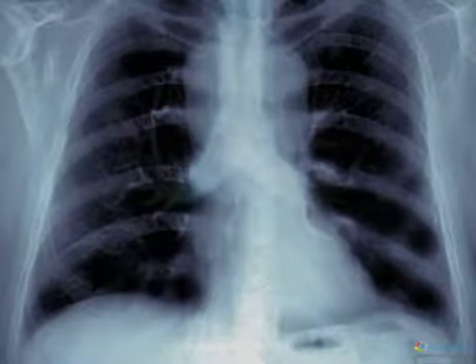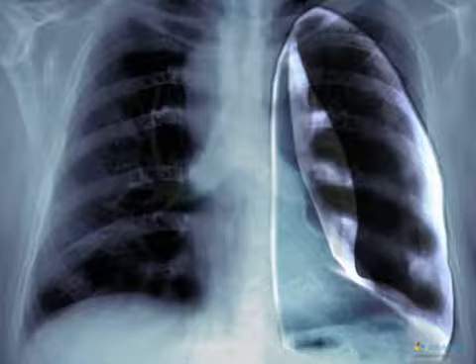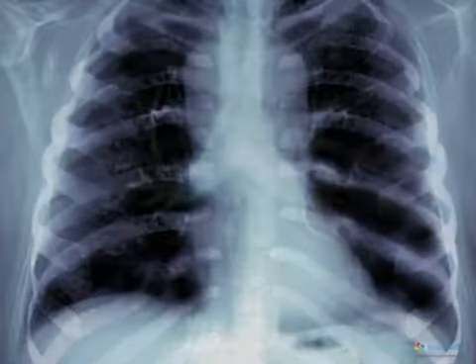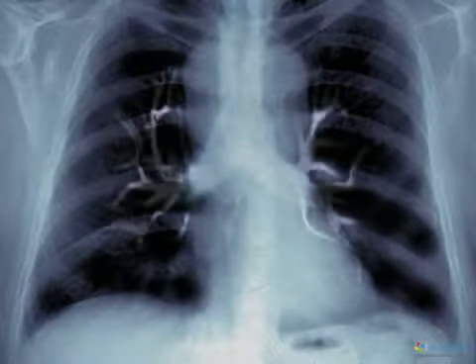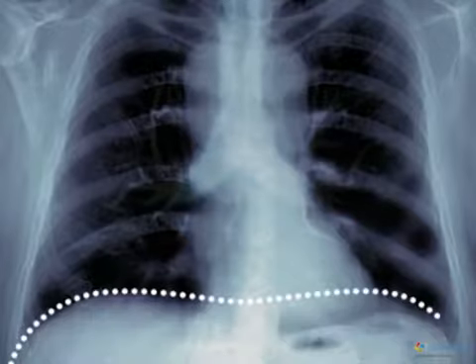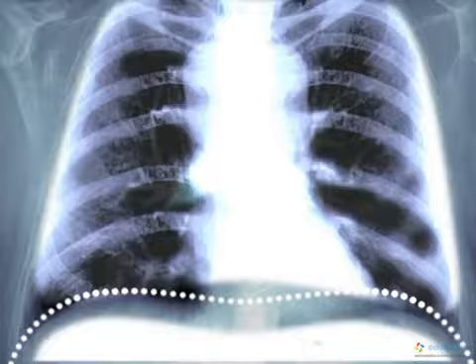In this photo, you can easily find the lungs, the left lung being smaller because of the presence of the heart. You can make out the ribs, the clavicles, and even the bronchi. You can also locate the dome of the diaphragm, which marks the boundary between the thoracic and abdominal cavities.